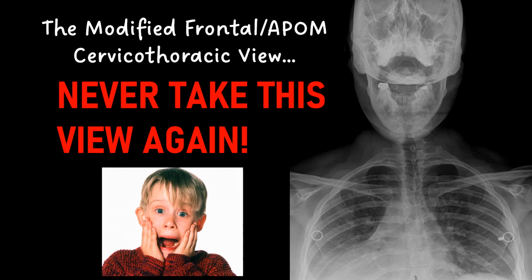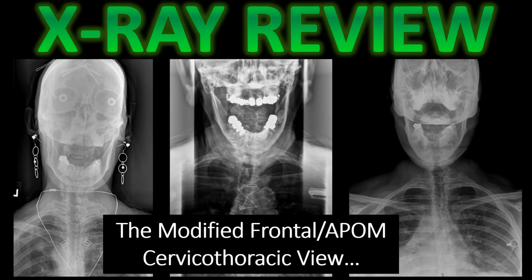In this video we're going to go through the modified frontal APOM cervicothoracic view and why you should never take this view. So if you have never seen this view before, that's a good thing. If this is something that you've come across, it's likely very frustrating because you can't see either the cervical spine or thoracic spine very well. Many doctors take this for postural analysis, but what is lost is the ability to exclude pathology and assess the bones.